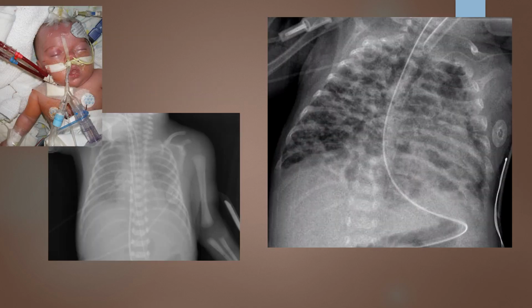So here's a couple little babies, and this is an example of one that you could be working with. These can be very intimidating. So obviously it mentioned that you might have to elevate this ET tube to get this artifact out of the chest x-ray. So you can see that this is mobile. If you have a nurse available to do that or a respiratory therapist, highly recommend that. So that could be shifted to the side or held during the exposure.